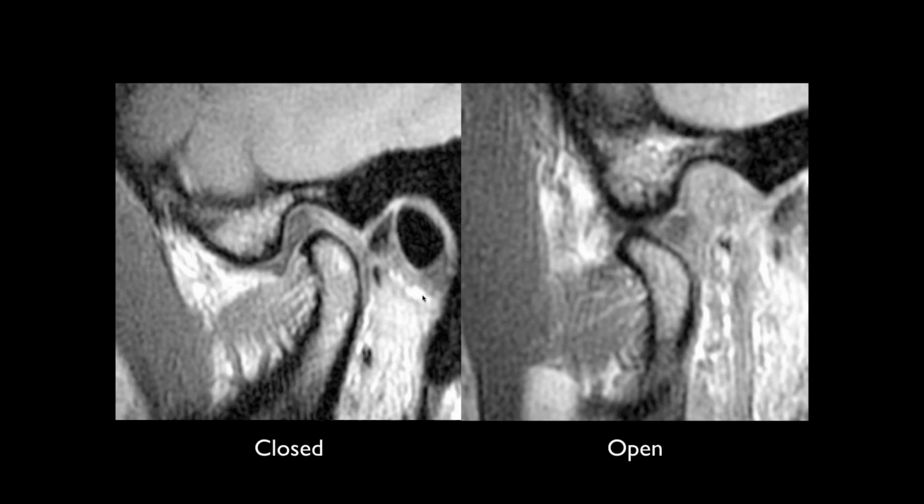And we'll typically look at these in the coronal as well as the sagittal planes predominantly. So here is the coronal plane where we can see this is the condyle and the mandibular fossa up here. This would be the discal layer in through here. And here's the sagittal plane.